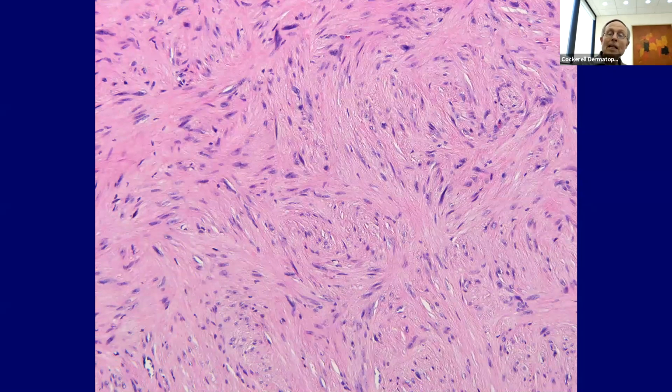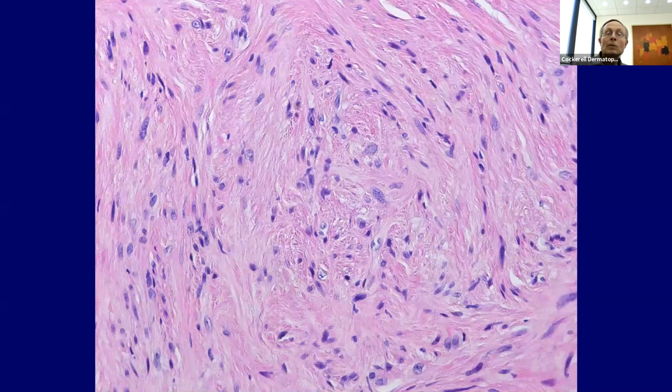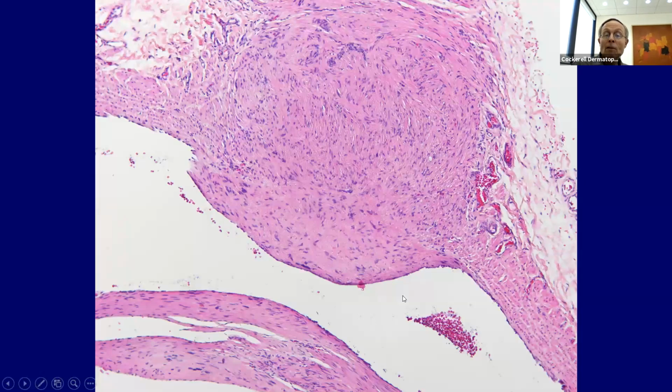Good. And this type usually looks like a small, round, nodular lesion. Those others are more plaque-like lesions. They're more diffuse. And so when you look at them under the microscope, they don't usually have this solid component like this, where you've even got some areas where there's a blood vessel. Over here, you've got a blood vessel where this kind of arose off the side of it. So this is an angioleiomyoma.